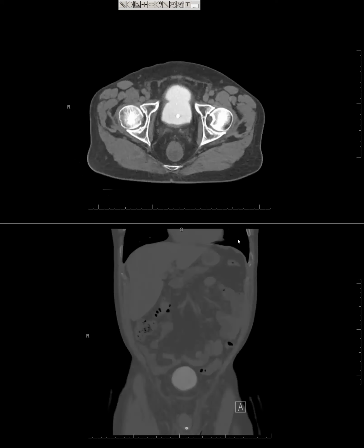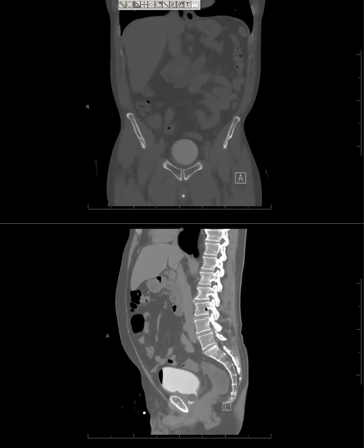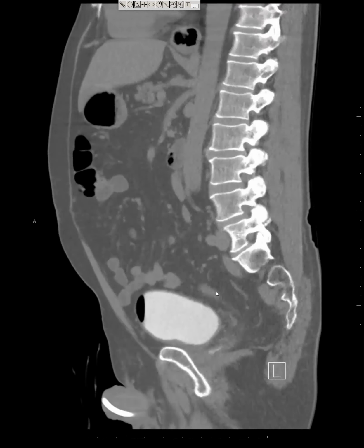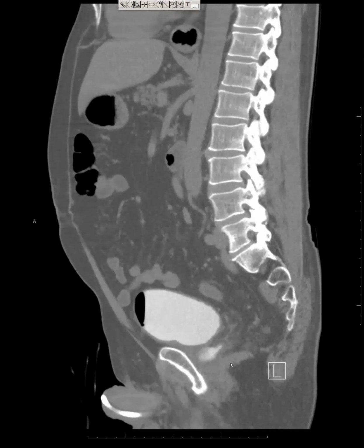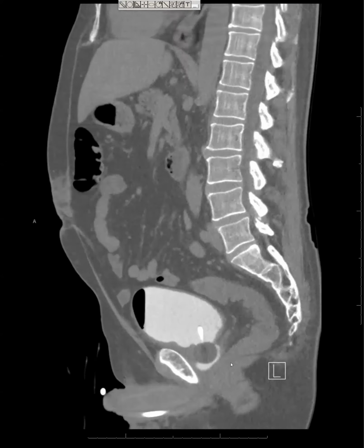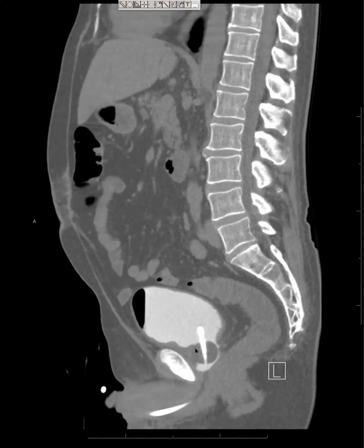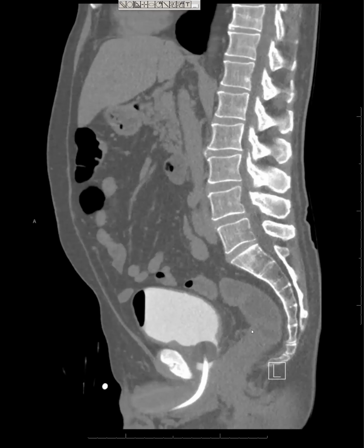This is about 3 weeks later, a follow-up CT cystogram, and the cavity is smaller. The bladder is a little bit lower. So they did achieve something in doing this. At one point, maybe the balloon was filled up in the bladder lumen and tugging it down and closing down the space. But it was conservatively managed, and they never really did have to do a reoperation to reanastomose the bladder to the urethra. It's basically just this cavity that closed down. And the patient has done well. I think the PSA has remained low. So the decision to do the prostatectomy based on what the MRI showed was appropriate.